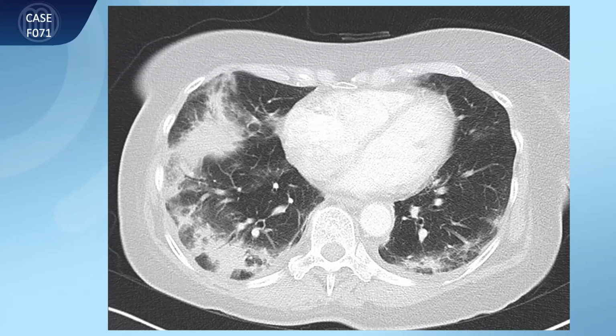Okay. Question set, yes, please. What do you see here? What is the predominant pattern? Oh, you're so good. That's great. Okay, then I can stop here because most of you are absolutely correct.